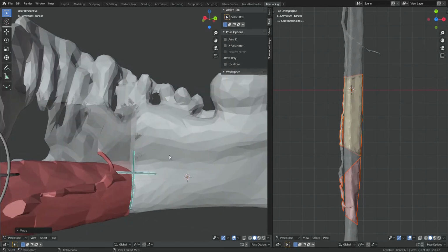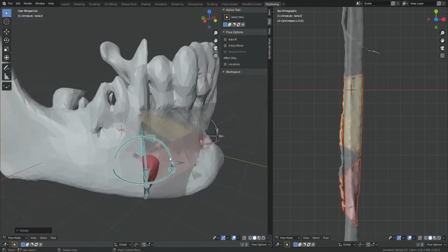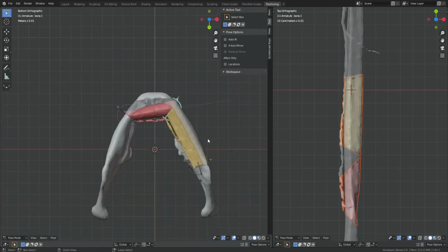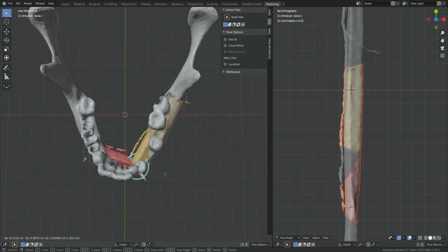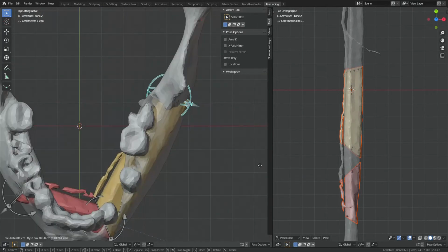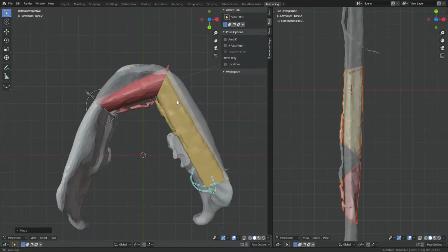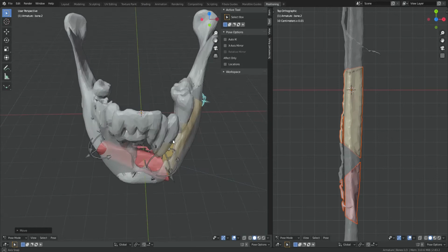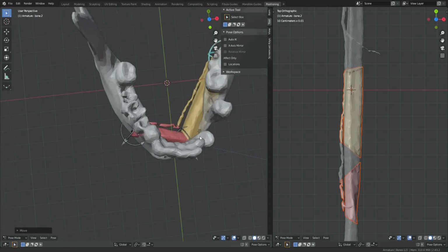This won't be ideal. It's not ideal, but the surgeons wanted to have a two-part graft, so I think this is the best option.